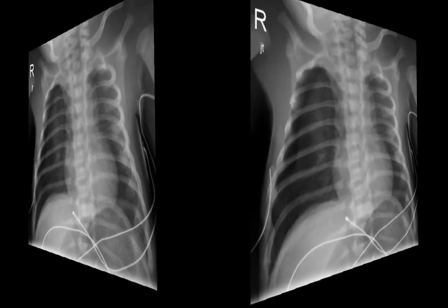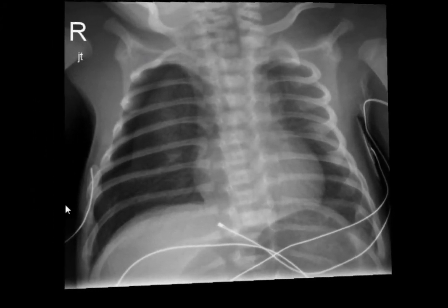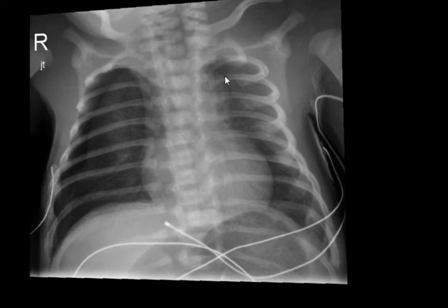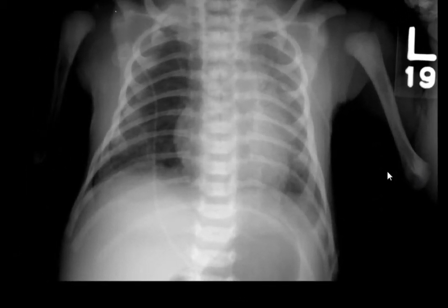There's a patient with an obvious large right pneumothorax. You can see the visceral pleura, which you don't need to see, as I already told you. But on the left side, if you'll notice, there's a medial hyperlucency, and the heart border on that side is as sharp as the heart border on the other side. So this is bilateral pneumothoraces, very large on the right and probably small to moderate size on the left. There's a patient also with a medial pneumothorax.